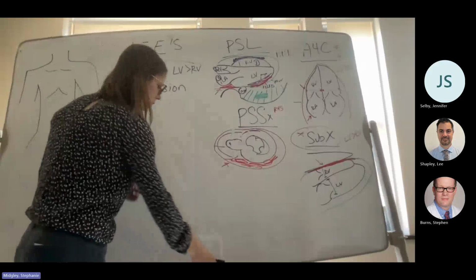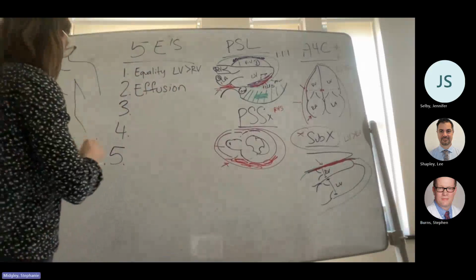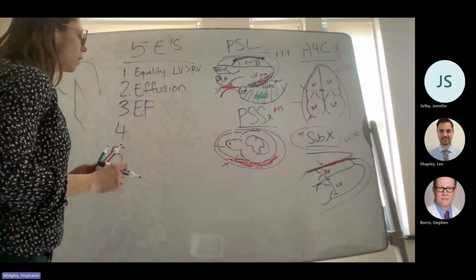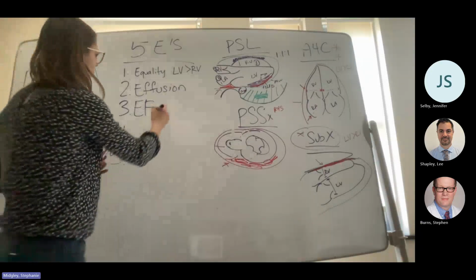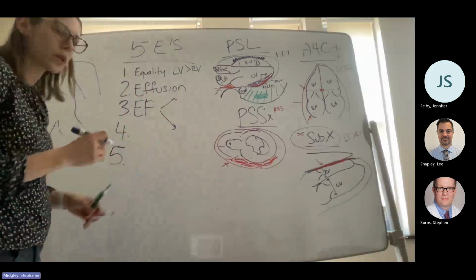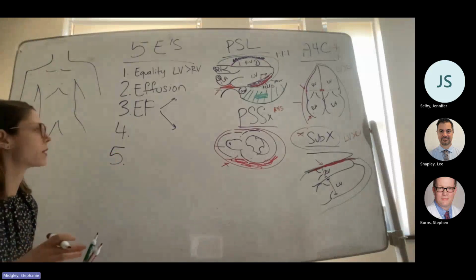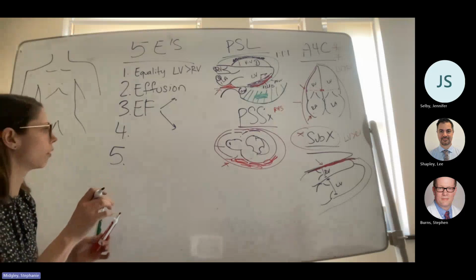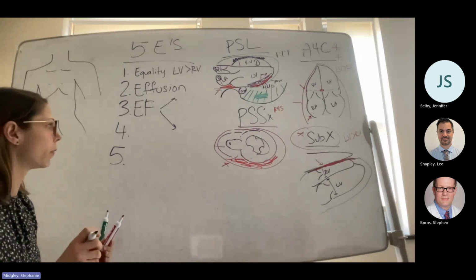What do you guys think? Ejection fraction. Yes, perfect. EF. I like to classify EF into 2 different ways to figure it out. For POCUS, I don't like measurements. I feel like for beginners, it's really easy to kind of mess up caliper placement and lead you astray on the EF determination. So I really much prefer eyeball.